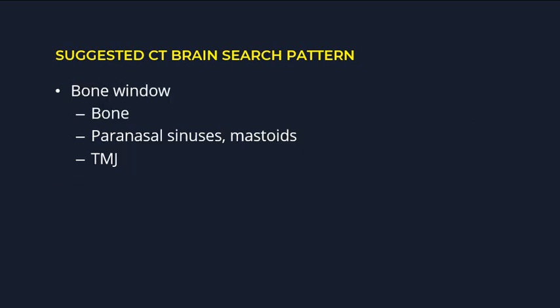And of course, do not forget the bone window images. Evaluate the bone for lesions or fractures, the paranasal sinuses and the mastoid air cells, the temporomandibular joints, and whatever is included from the cervical spine.